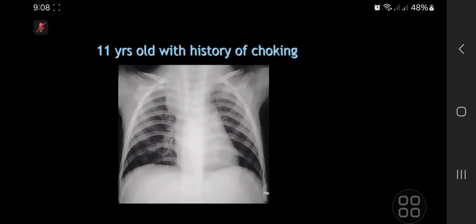Cervicothoracic sign is there on the right side, and on the contralateral side there may be a bit of opacity. So appearances are suggestive of some superior mediastinal pathology. The top differential could be an enlarged thyroid or retrosternal thyroid causing this tracheal compression and choking.